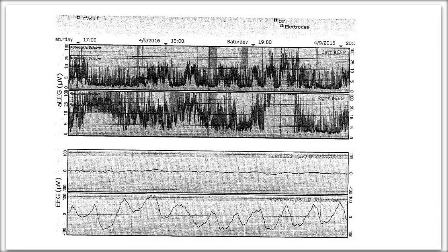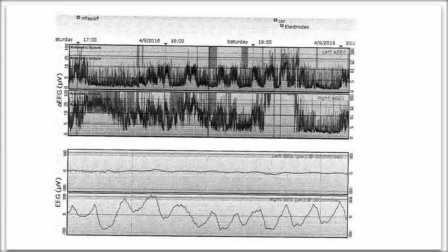So first off, we always want to know the baby's story. This is a preterm baby, had a rough start, and we're monitoring for 3 days. The baby's on high frequency, which we know always complicates interpretation. And then we also know that there was some suspicious areas for seizures. So we know the baby's story, kind of the background.